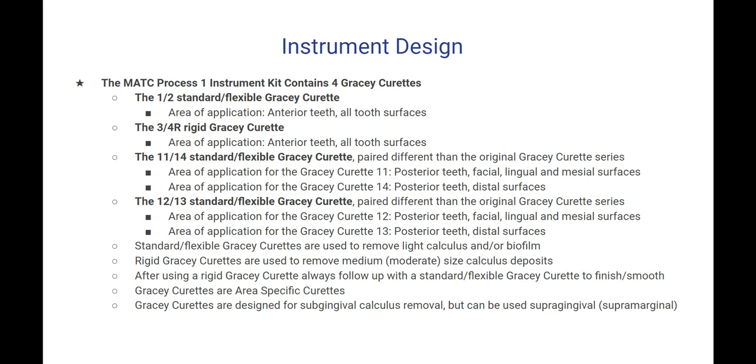The 12-13 standard flexible Gracey Curette again is paired different than the original Gracey Curette series. Area of application for the Gracey Curette 12, posterior teeth, facial, lingual, and mesial surfaces. Area of application for the Gracey Curette 13, posterior teeth, distal surfaces.